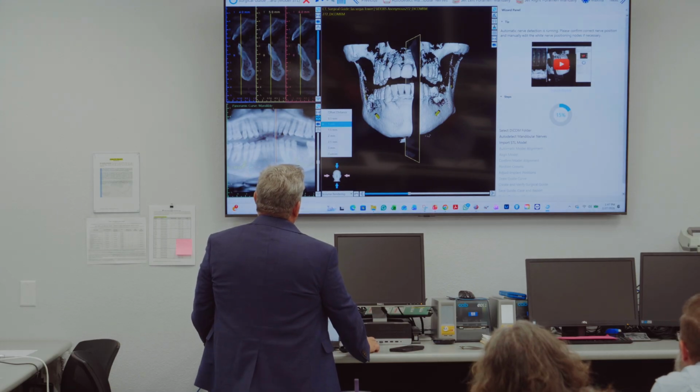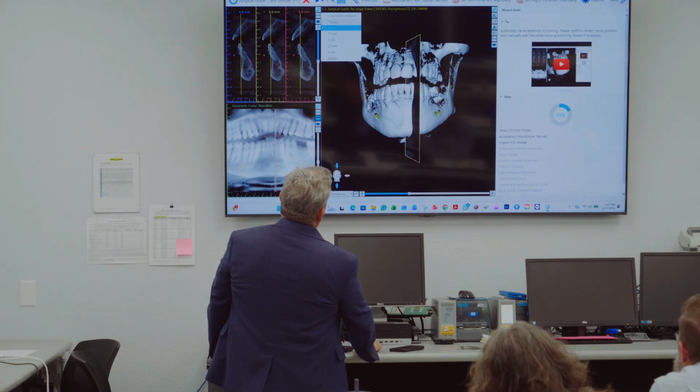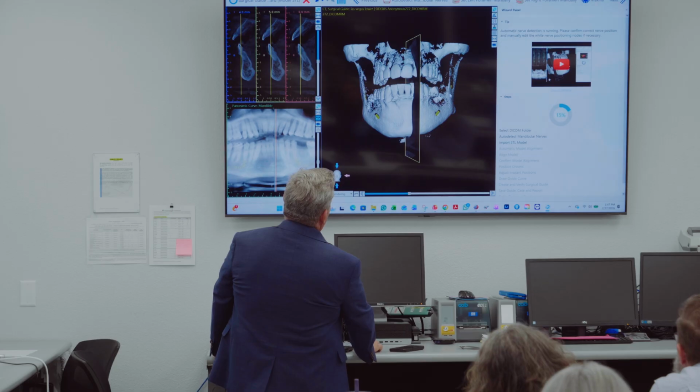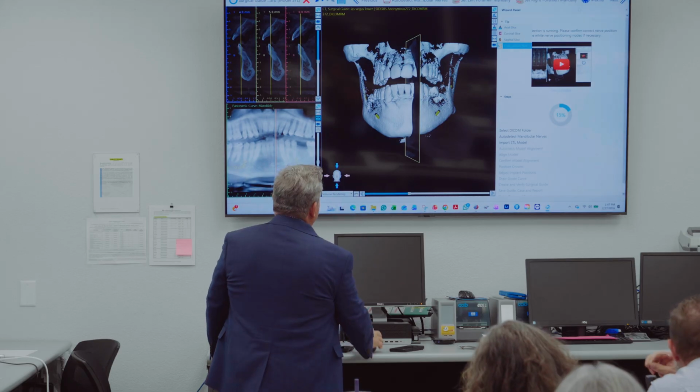You can actually look at the distance of your slices or the thickness of your slices if you want to. You can put a grid on if you'd like, if you want to make measurements. That's already on there. Let's see, what are these over here? I think these are just different renderings, different views, and you're going to get more into this when you get into the full version, the advanced version.